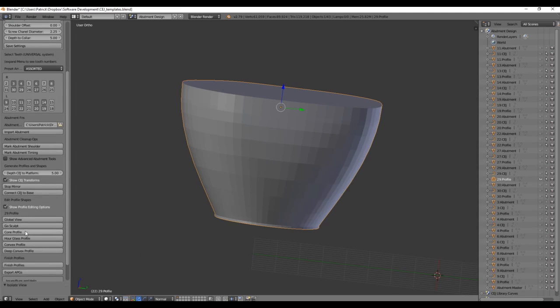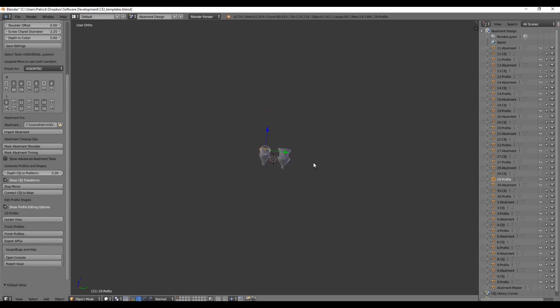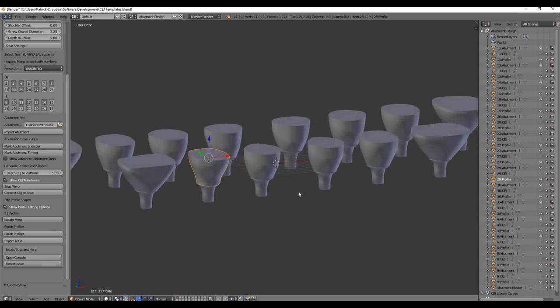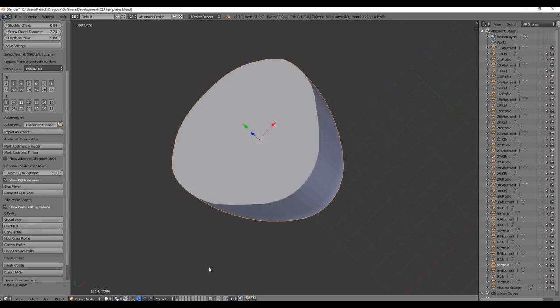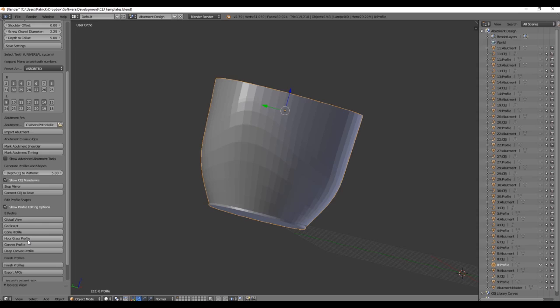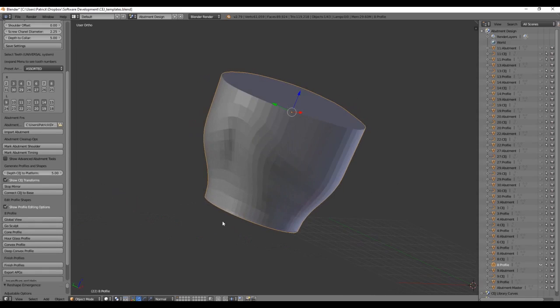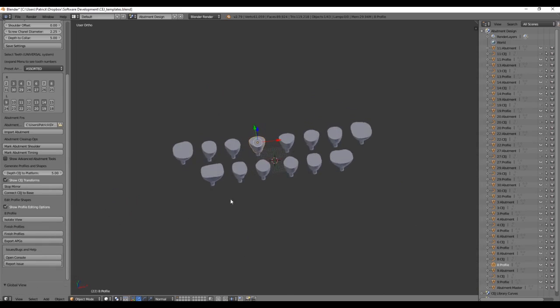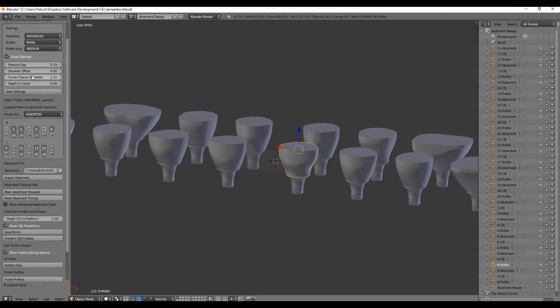You can change this individual profile to cone, hourglass, convex, or deep convex. So if you have some teeth in your series that you would rather have just that one tooth be hourglass shaped, you can isolate your profile, reprofile this tooth as hourglass, go back to global view, and your other ones will have the same profile as you originally selected.